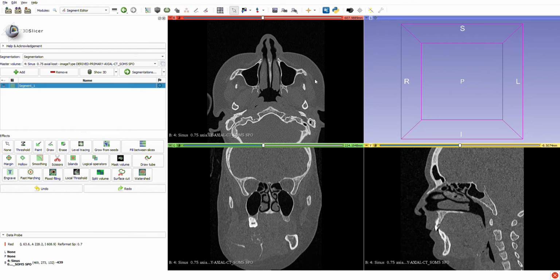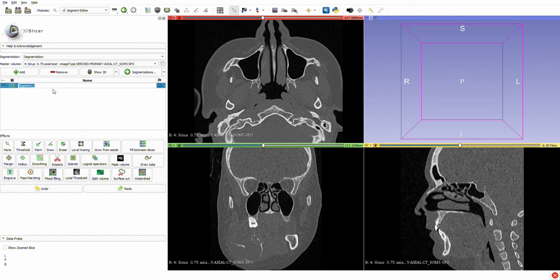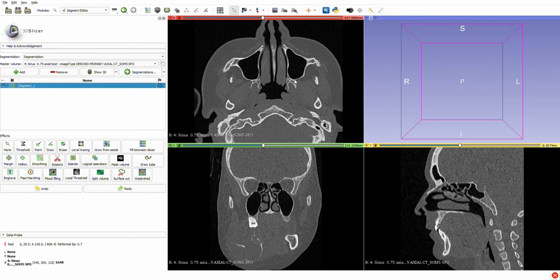So everything starts with loading DICOM data and segmentation of the bones, actually the mandible and fibula. I'm using 3D Slicer, and most of you will, well, not agree with me, but I like to perform semi-automatic segmentation, mostly manual, because I have more control and there is less post-processing in the software with cleaning of the model. So when you load the DICOM data, over here you can write and change the name of the model because of the patient privacy. I'll just leave it segment 1.